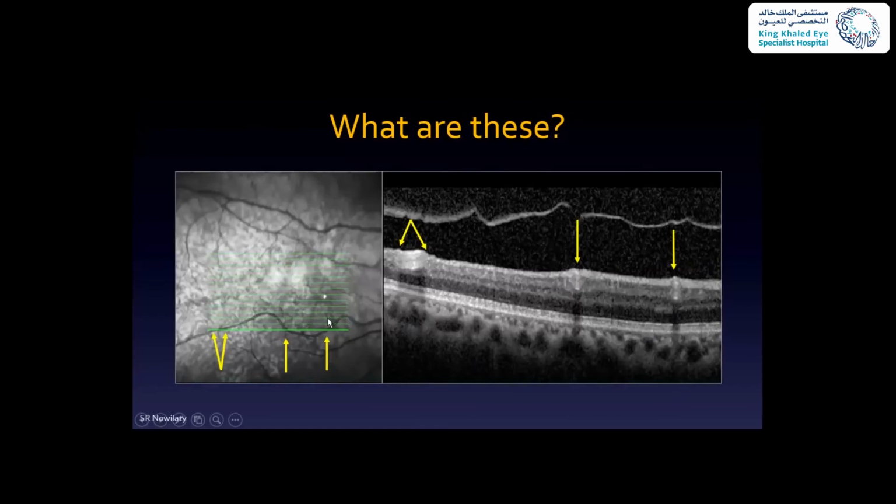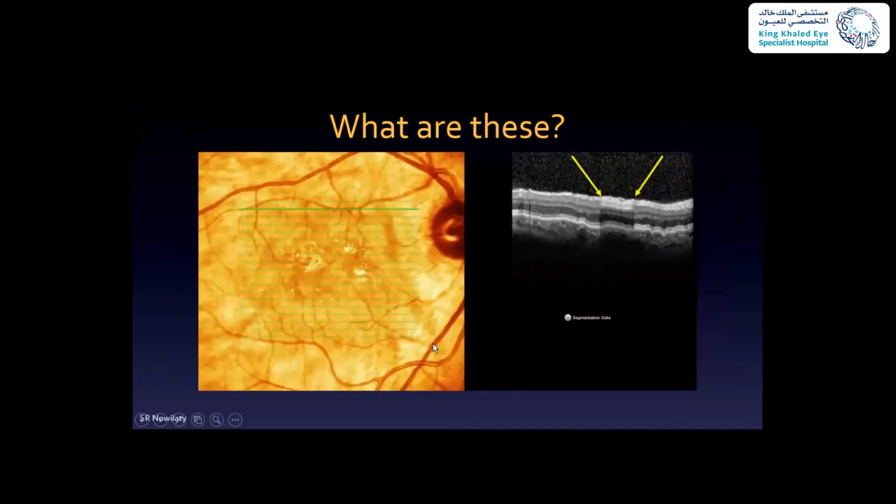This vessel here is this one, and this one you can see that it's kind of broad, and that's because the line went through the vessel tangentially. So it's not cutting the vessel right straight on, but it's actually going throughout the vessel as the vessel is horizontally oriented. So you can see the broader line and a broader shadow. Okay, so these are typical blood vessels.